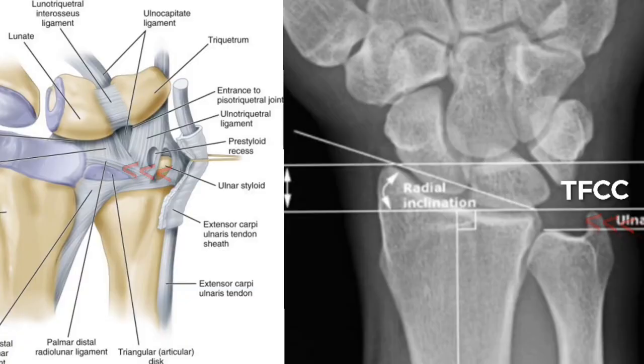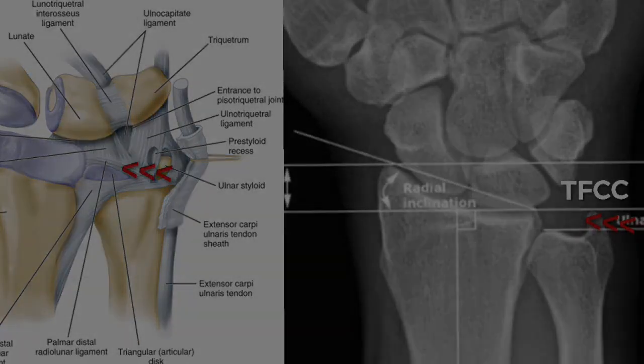Finally, we should always remember that we have a complex structure named the TFCC, triangular fibrocartilaginous complex, at the space shown distal to the ulnar head in the true AP view. So, the displaced fractures of the ulnar styloid may refer to accompanying injuries in this complex to be further studied by MR imaging. What about the normal criteria at the wrist?